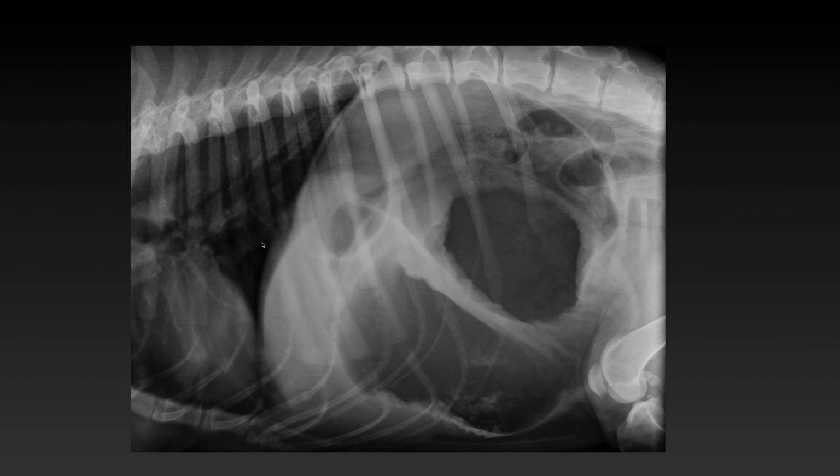So what else to think about? You should always check the entire gastric wall to see if there are any signs for necrosis. Make sure you've seen all parts of the gastric wall that are available in the radiograph. There are a few mineral opaque particles in the most dependent part of the stomach, which is considered an incidental finding. You check the remaining part of the gastric wall to make sure there are no small gas inclusions or signs for a gastric rupture, because these patients will have a much worse prognosis.